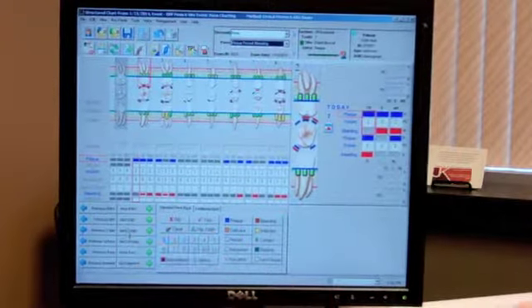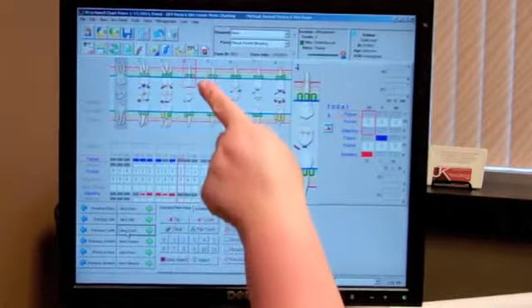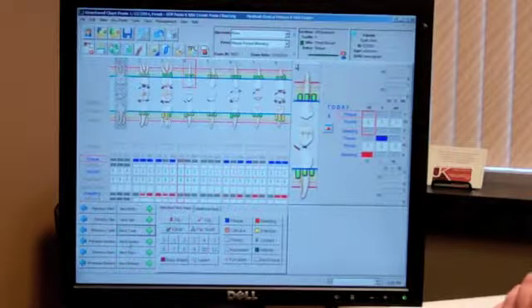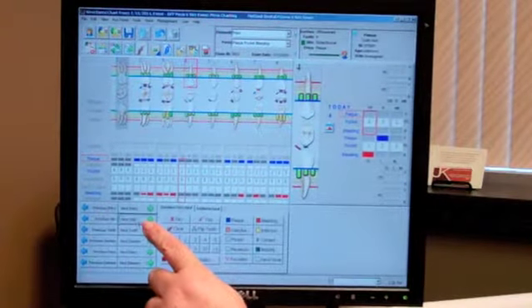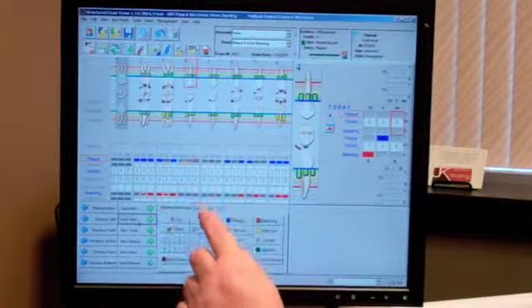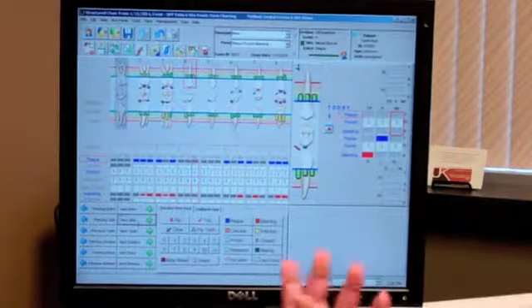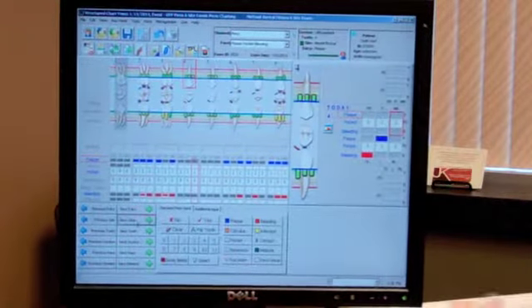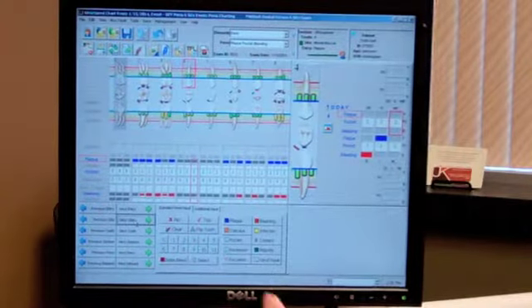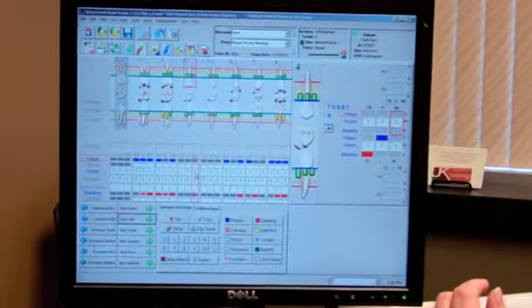So now you'd have to do next tooth, next tooth. Now if I wanted the mesial buccal, I would say next site, next site. And there it's highlighted with the red box, and I could change that. Then I'd say a new number, say it's really a 4 millimeter. So I could in voice activation say 4 millimeter. Otherwise, you would click on the number here, and it should pull up.